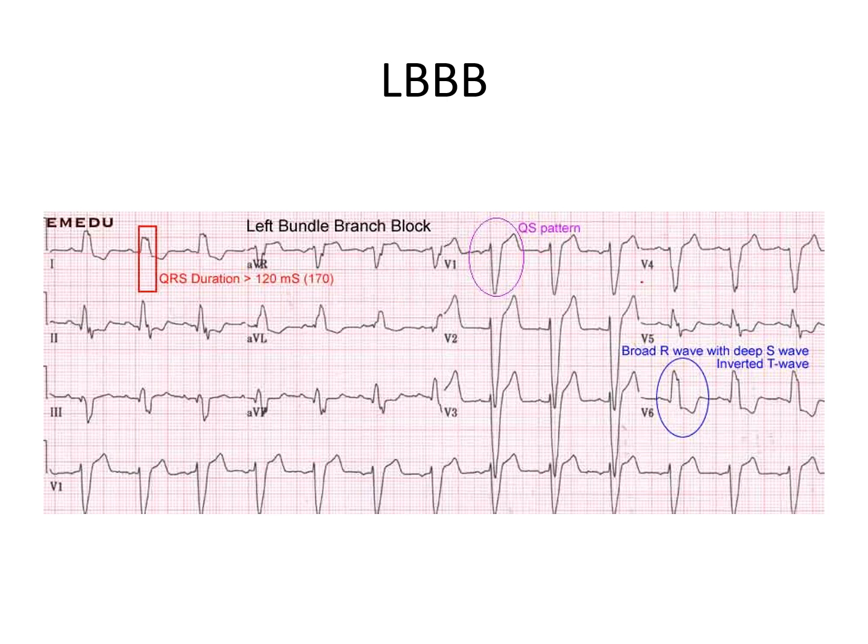Third, you will notice what's called QRS to ST discordance, which means that when the QRSs are positive, we have ST depressions, and where the QRSs are negative or downwards deflection, we have ST elevations. This does not mean that there is ischemia. This is perfectly normal, and we will explain why in a second.